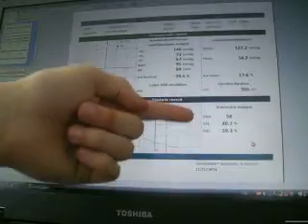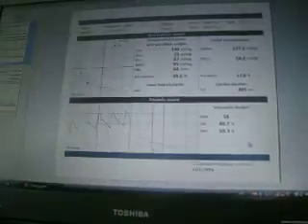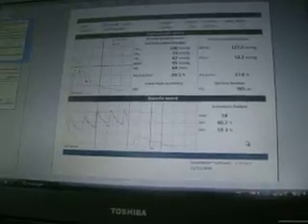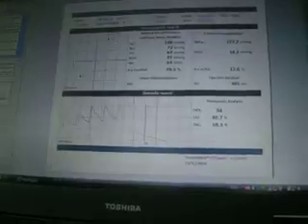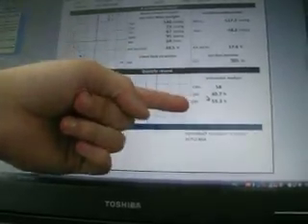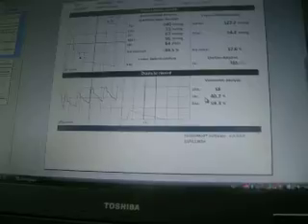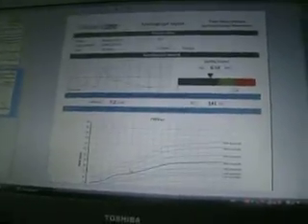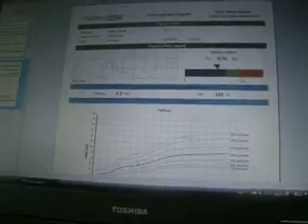These three altogether are called cardiac fitness parameters and show you how the coronary perfusion is for that particular patient. The higher the DRA and DAI numbers are, the better the coronary perfusion is, showing a good condition of the coronaries or the heart itself.